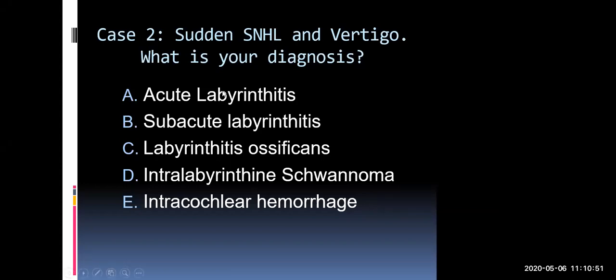So this is a case of acute labyrinthitis. So if you actually get an imaging study on a patient who presents very suddenly, and they have the classic picture of sudden hearing loss with vertigo, you can actually see that. Now, you have to remember vestibular neuritis and labyrinthitis. These are old clinical terminologies, mostly before radiology, MRIs were available. So if the patient just had vertigo, we would say they had vestibular neuritis. If they had sensory neural hearing loss, we would say, well, they must have labyrinthitis. For most parts now, we just call them vestibular neuritis and sudden sensory neural hearing loss with vertigo.